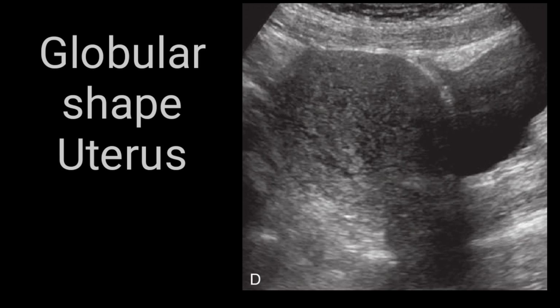The fourth ultrasonic feature for adenomyosis is a globular shaped uterus. Many a time you come across a globular shaped uterus. You cannot make head or tail of it, which way we should look for the fundal region or how it will look while the lower uterine body is concerned. So it just looks like a globular and round shaped uterus. If you come across a globular shaped uterus, you may consider adenomyosis. Although this is a very rare entity, still you will see it on ultrasound imaging. So the fourth form is globular shaped uterus.